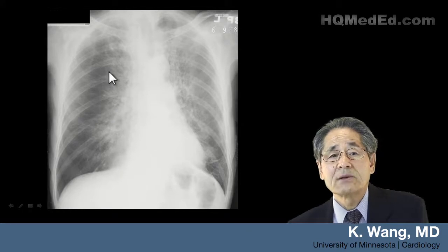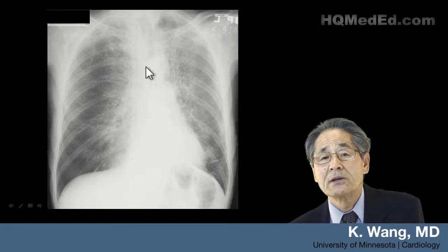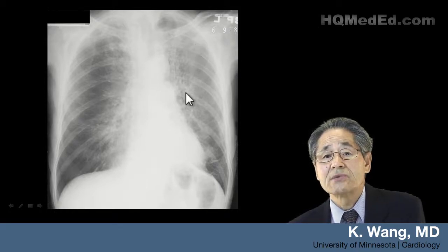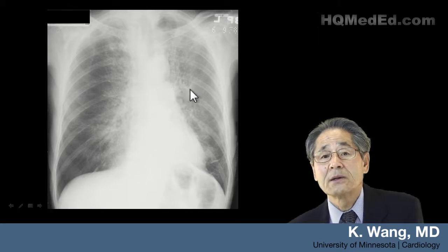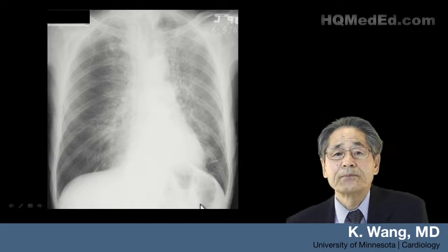What could affect the tissue inside of this vertical line without spreading outside? Not as clear as here, but again, inside of this vertical line, not affecting outside of this vertical line.